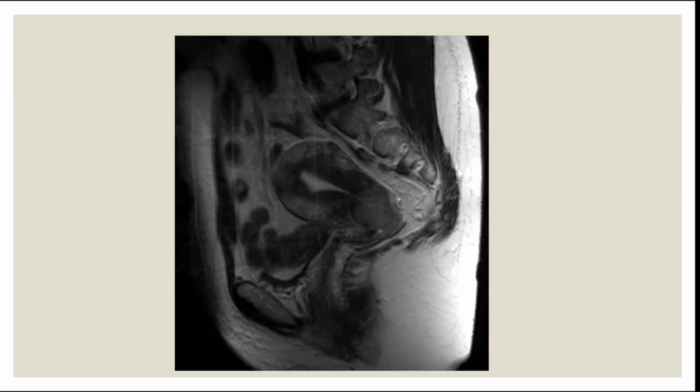Uterine fibroids. You're right that this is the uterus, this is the reproductive system. Uterine fibroids, I think they could be a bit more inside the uterus, but this is not a bad guess. This is a great guess. It could be. Actually, you can see a lesion not at the uterus, but at the cervix. This is in the cervix.